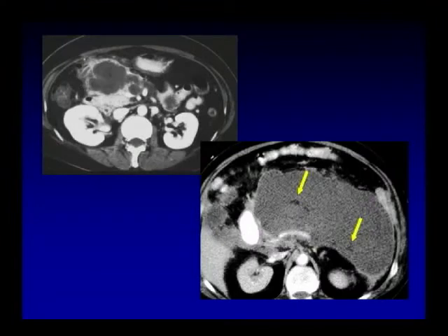The first patient has several fluid collections, so clearly a grade E. Enhancement of a defined rim. And so these are evolving into pseudocysts. You can see in the second patient with the larger single fluid collection, there are little islands of fat still located within the fluid collection, and this is pathognomonic for pancreatic fluid collections.